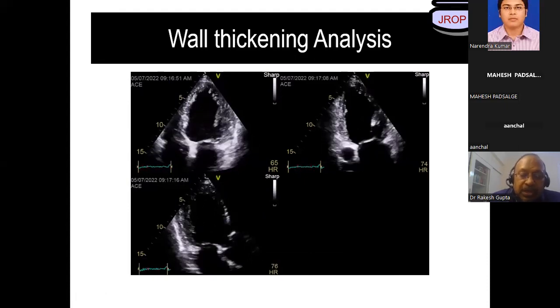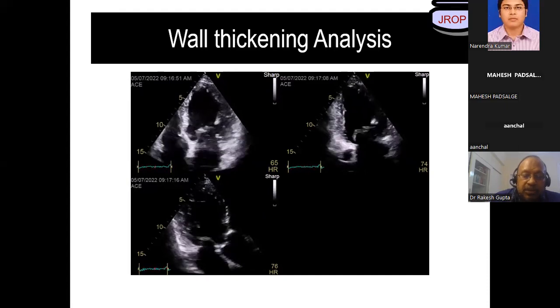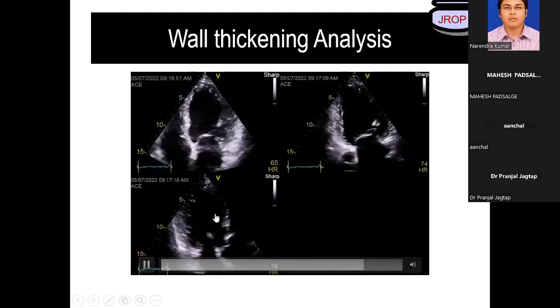We are coming closer to finishing this topic, this session of the 46th course. And today you're telling me that is the inferior or anterior wall. In 3-chamber view, is this inferior or anterior wall? Sorry, septal wall, sir. Even this is not septum. I'm sorry to say this is not septum at all.